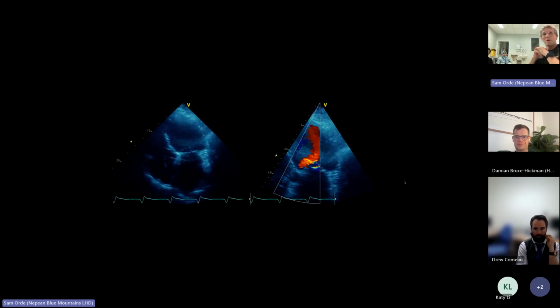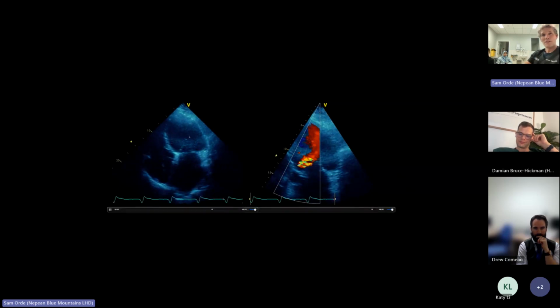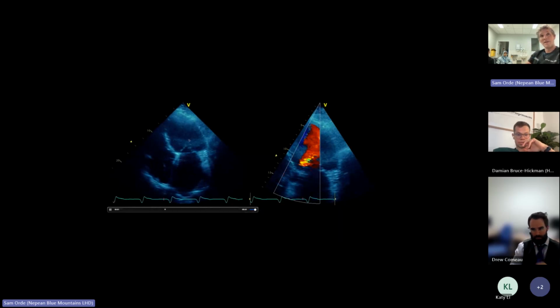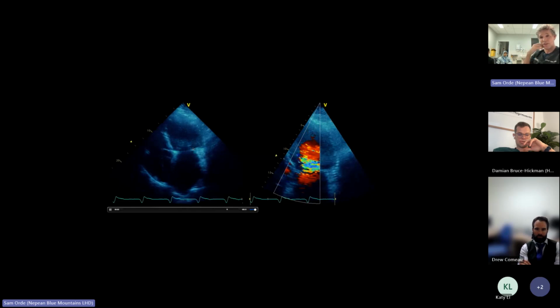So what about this one, Rishi? What can we measure on this one to try and estimate what systolic function is? So we can measure the dP by dt. dP dt, right? When patients are having caths, when they used to do a lot of LV hemodynamic assessments, one of the things that they can look at is what's known as the dP dt, which is how rapidly a pressure changes over a certain amount of time. And then from that, they can figure out how well the heart's systolic function is.